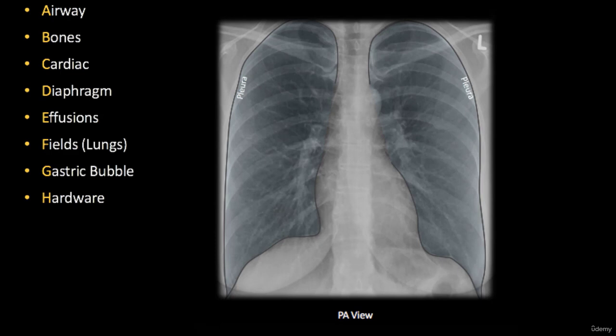The fields of the lungs should not be absolutely transparent. We have some soft tissues, we have vessels and bronchial trees, which you see here on the right and on the left, running up and down from the roots of the lungs. Some shadows are the bronchial tree, and smooth lines all the way around belong to the vessels. Hypertransparency of the lung field is a sign of lung emphysema. It's not very good. That means we have too much air inside, which cannot find the way out.